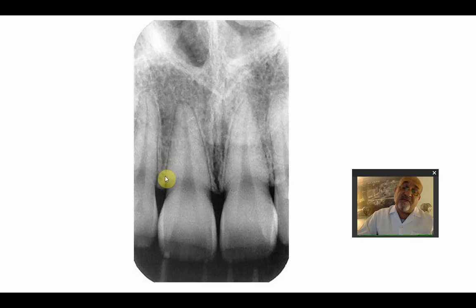plus, which is composed of cementum and dentine, plus the bone or the socket which is covering the root. Now the other line over here represents the crown composed of the enamel and dentine plus the shadow of the lip. Of course here is also the shadow of the lip covering, but we can differentiate it here because of this difference.